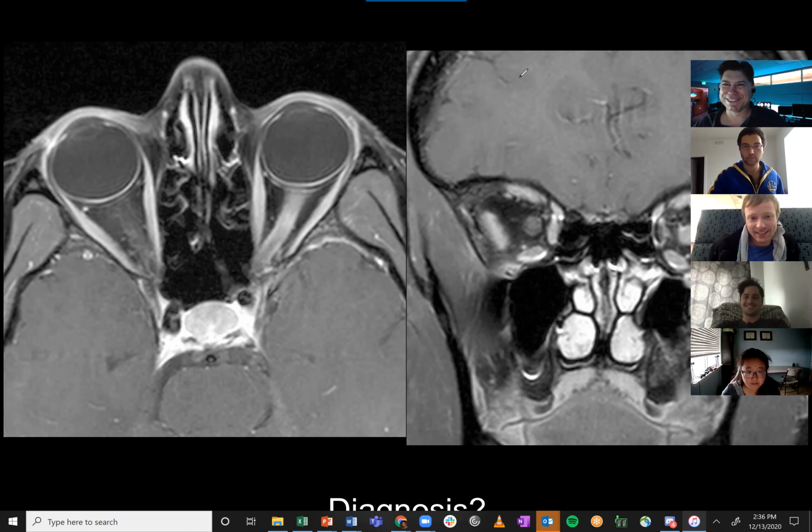But theoretically, touching your eyeball is like touching your brain, right? Okay. Cranial nerve 2 never has a transition between central and peripheral myelinization. So it's all central. So this is a good case of neuritis. This guy had MS, maybe start having a discussion about Devic's or something else like that. You might want to do a diffusion to see if it's bright on diff and dark on ADC, because you can get ischemia of cranial nerve 2. We never talk about that with other cranial nerves.